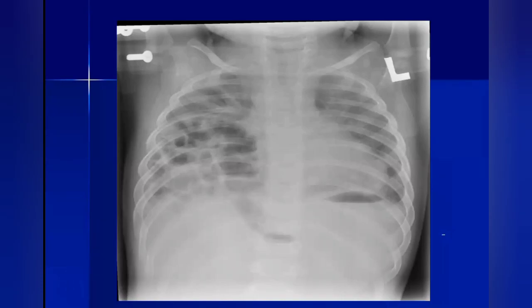What are the associations with diaphragmatic hernia? Sir, there are multiple pathologies, like vertebral anomalies, and I can see in some trisomies also. But let's concentrate on the chest. What are the abnormalities commonly associated with diaphragmatic hernia in the chest?